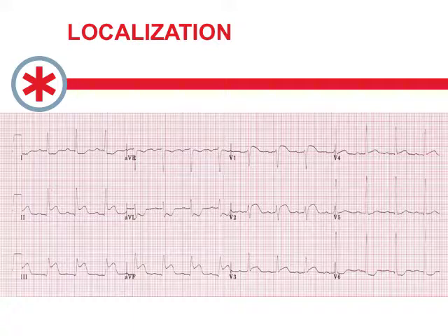So the obvious things that jump out at you: ST elevation in leads 2, 3, and aVF, making you think that you've got yourself an inferior infarct, which is very true. But the anterior septal leads, V1, V2, certainly are elevated also, making you a little worried that you've got a right ventricular infarct and RV involvement here. So certainly this might happen with basically a large RV infarct going along with your inferior infarct.